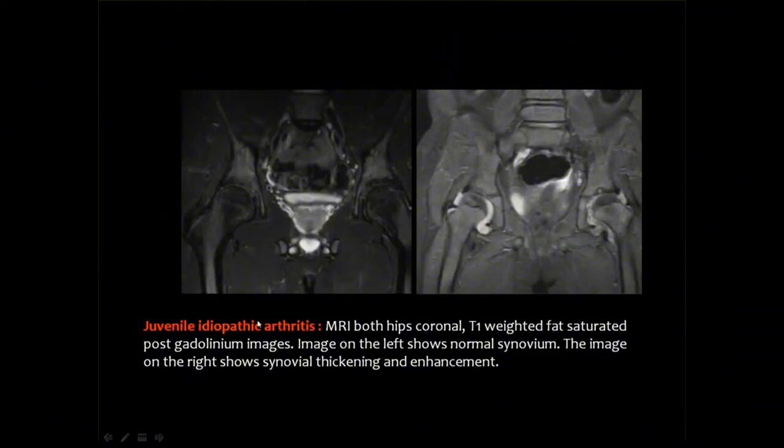And this is an example which is not so much different from the previously mentioned disease, which is transient synovitis. In the T2 weighted image, you may see normal findings, but this is the appearance of a joint effusion, and as I have mentioned, you are not able to appreciate the synovial thickening unless you inject contrast material.